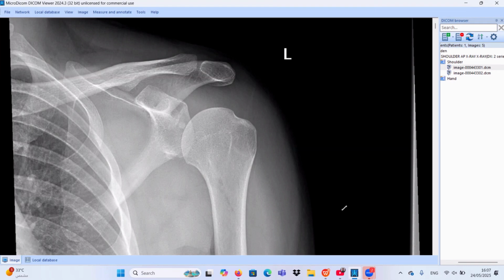I think it's a Bankart lesion, and this is Osseous Bankart. Also, when I look carefully at the humeral head, I can see there is a depression at the superior lateral aspect. Altogether, the fracture in the glenoid inferior aspect and the depression in the superior aspect of the humerus, this is a Hill-Sachs lesion associated with Bankart lesion. Okay. So yeah, very nice.